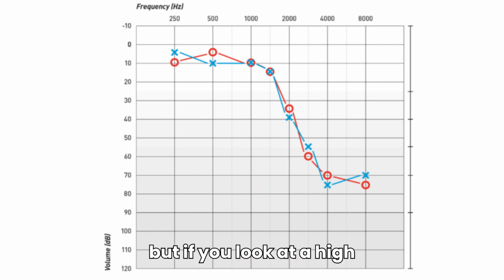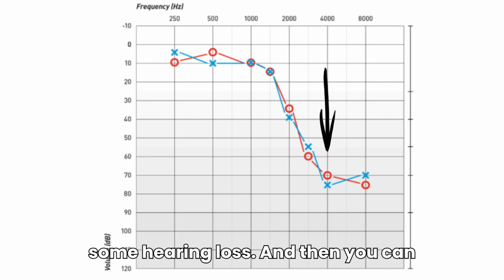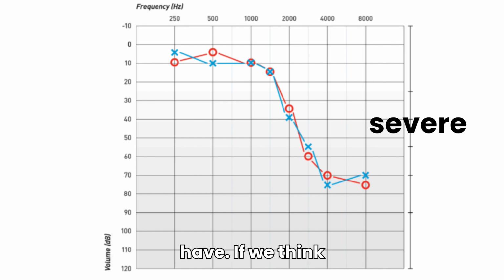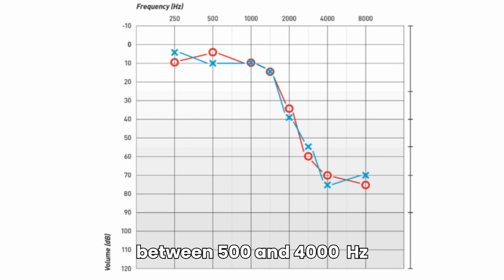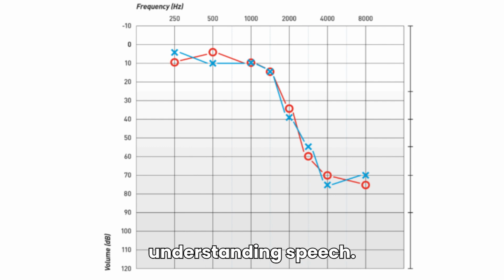But if you look at a high pitch like 4000 hertz, you might have some hearing loss. And then you can see what degree of hearing loss that you have. If we think about speech and sound, between 500 and 4000 hertz are very important frequencies for understanding speech.